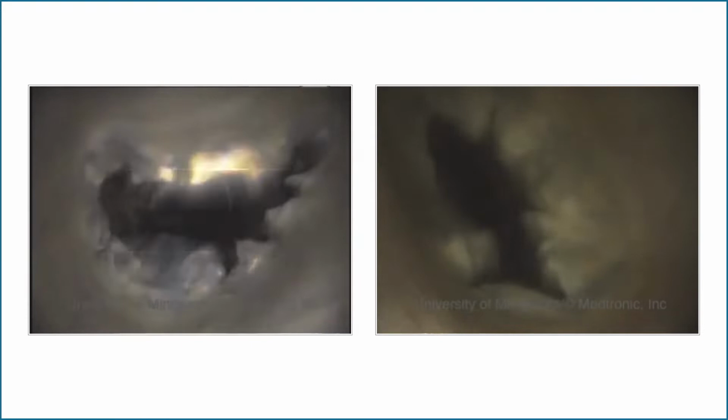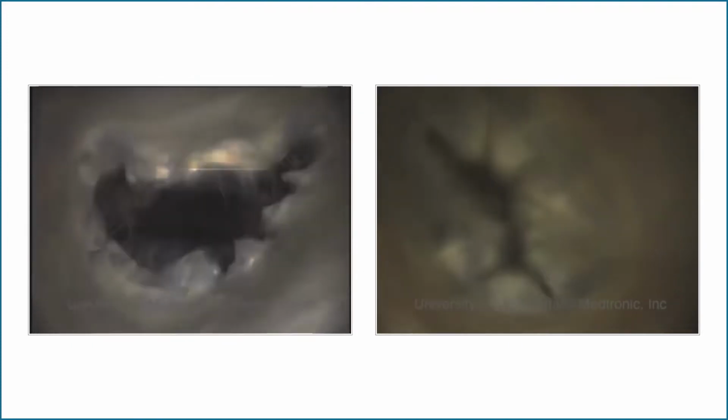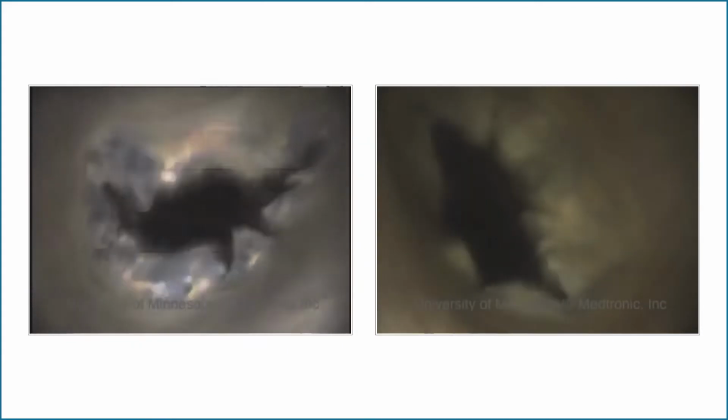Remember in the third chapter, which dealt with the mitral valve, and also in the sections where we showed you how to image, we talked about the normal motion of the mitral valve. You see that the anterior and the posterior leaflet coapt along a certain surface here. You can imagine that if you have just a little bit of leaflet retraction or tension on the leaflets, or a part of the leaflet which is ruptured, you can easily get significant mitral regurgitation.